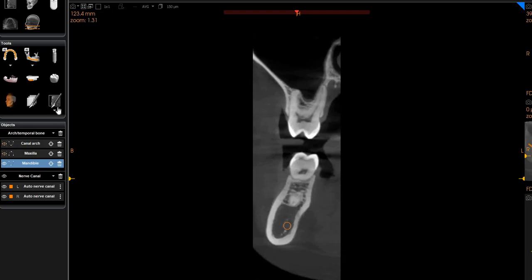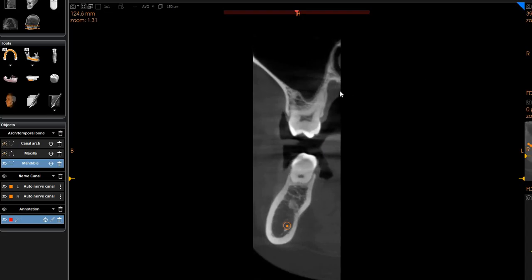The reason why we thought that there was a radiolucency is because of this particular thing that we see right here. It's just an anatomical landmark from the palate, and hence it is not a radiolucency.